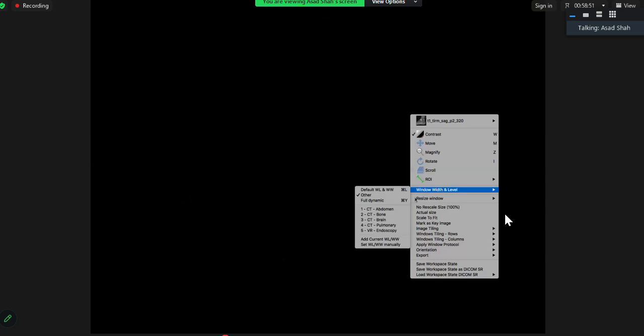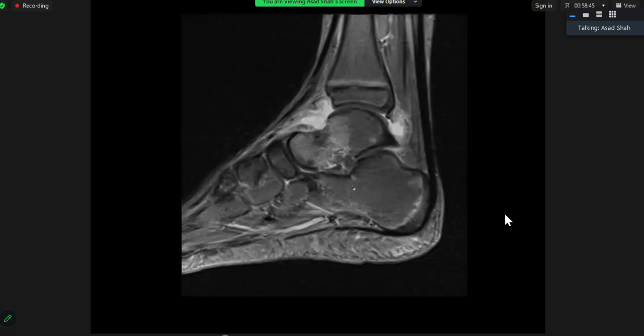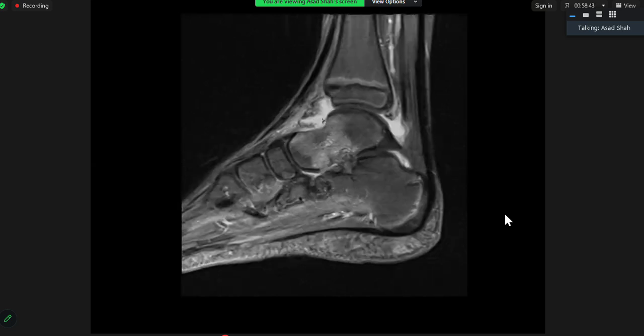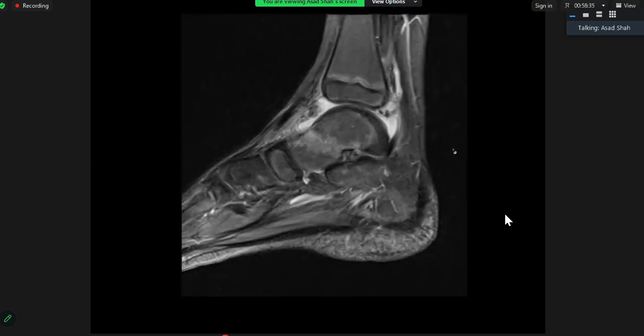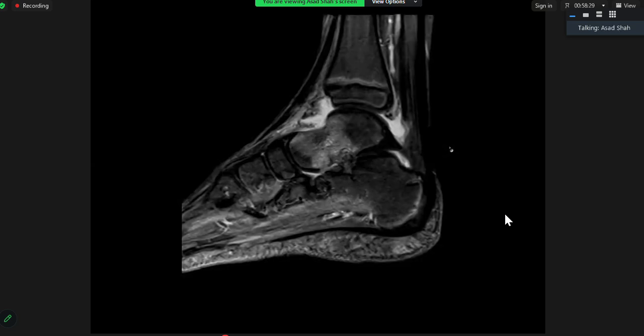You said septic arthritis. Obviously that will be in the differential, but there's one thing. Which side? I mean, let's say this joint is full of pus, right? So you will get marrow edema on both sides, isn't it? Over here, where is the epicenter of the marrow edema? Where is the marrow edema here? This is in the center of the medullary cavity.